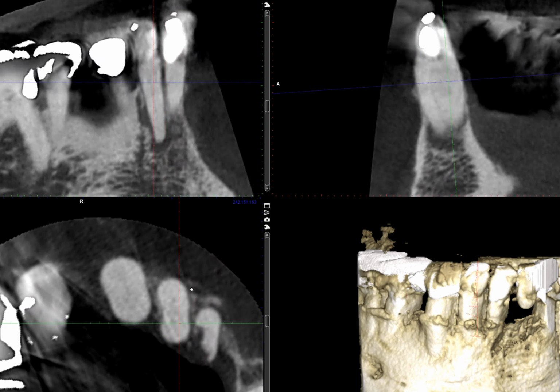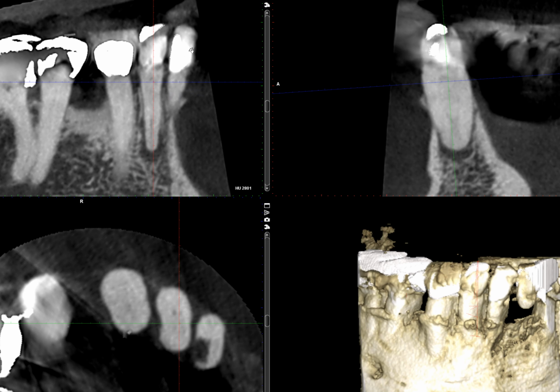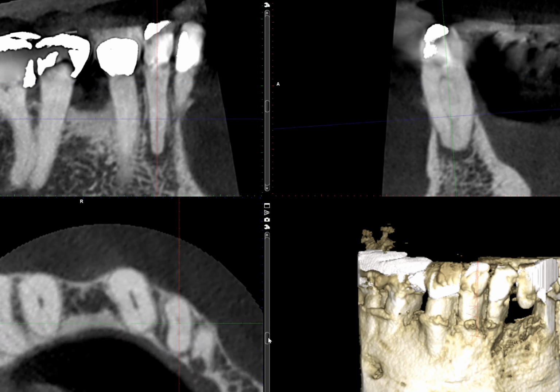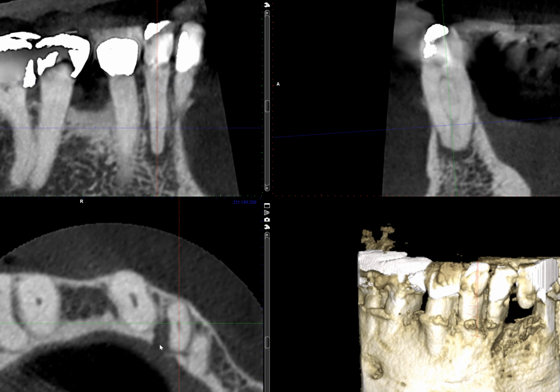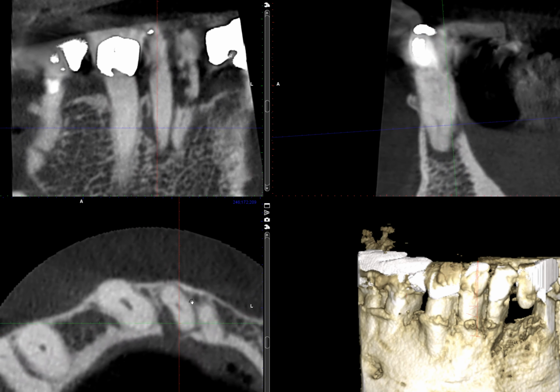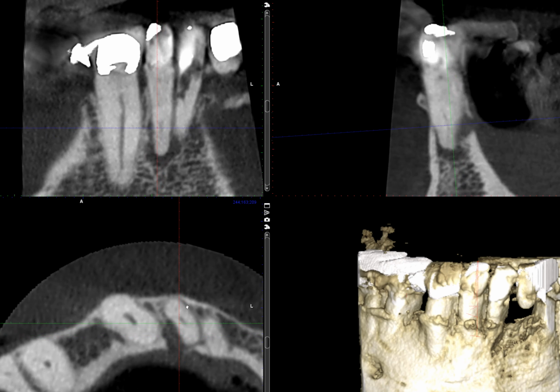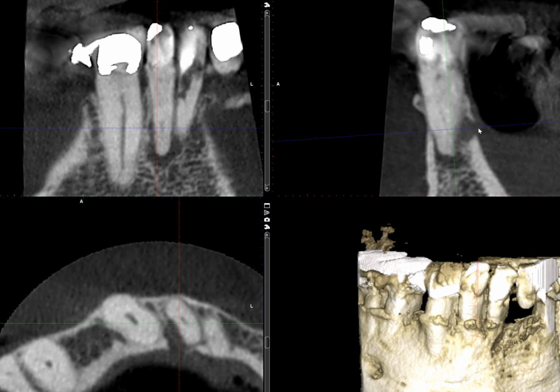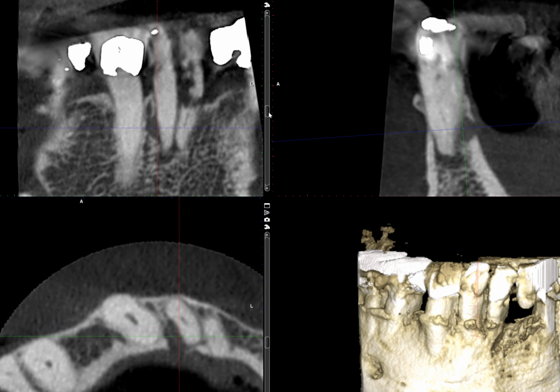Now let's take a look at the adjacent tooth, number 26. I think what we saw from the periapical radiograph was a relatively well-defined radiolucency at the apex. But what was surprising to me was that right here. Let me rotate that so that we can capture that bone loss. Here, there's a radiolucency that's on the side of the root. Look at the sagittal view. And look here, coronal as well.